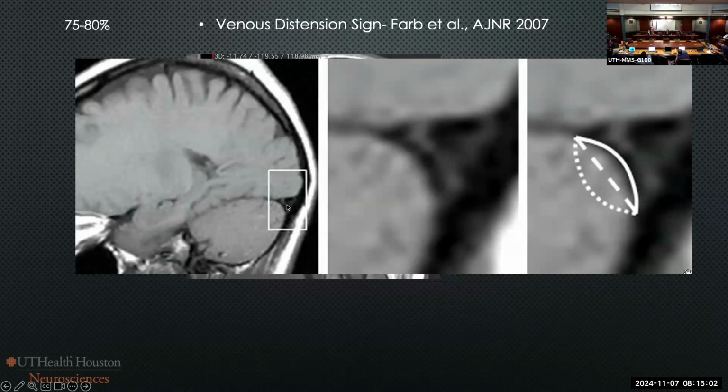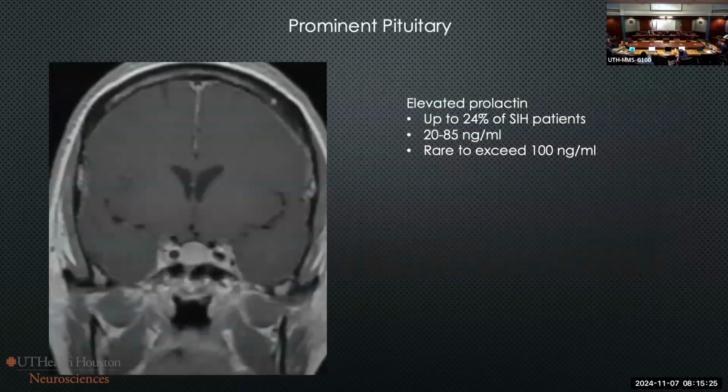The margins are concave. So if you look at the inferior surface of the transverse sinus, it should be concave, maybe flat, but not convex. If you look at an axial CT scan, you're familiar with looking at the sagittal sinus posteriorly as a delta, right? If it rounds up like a ball, that's not normal. That's venous distension.